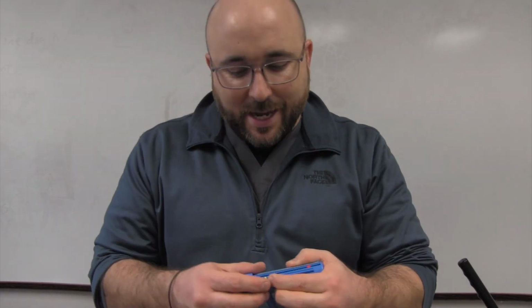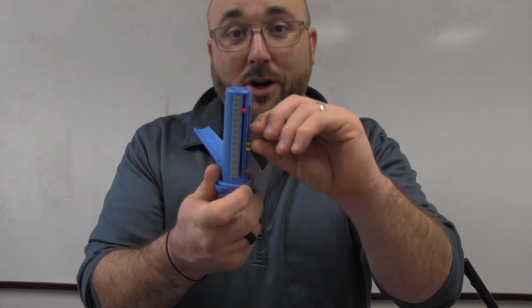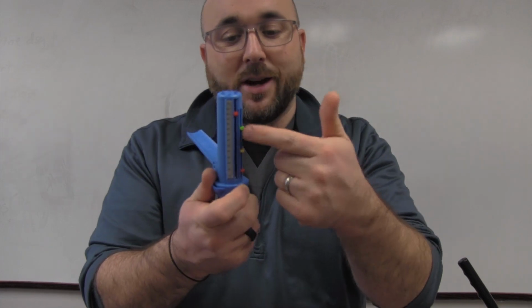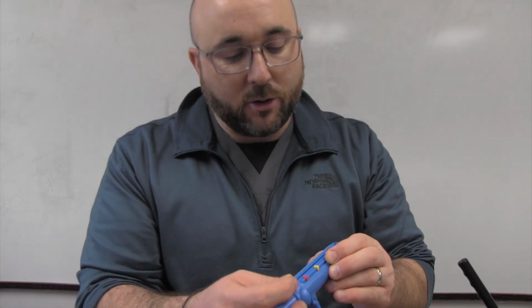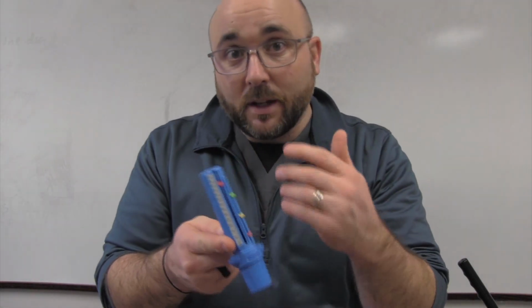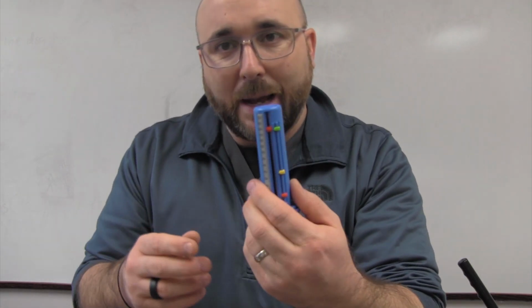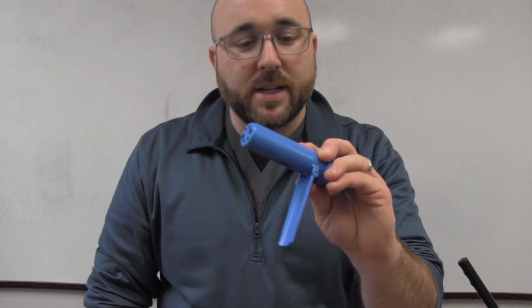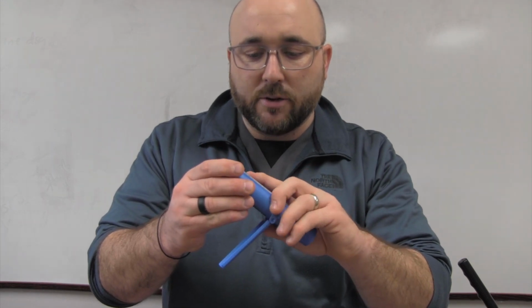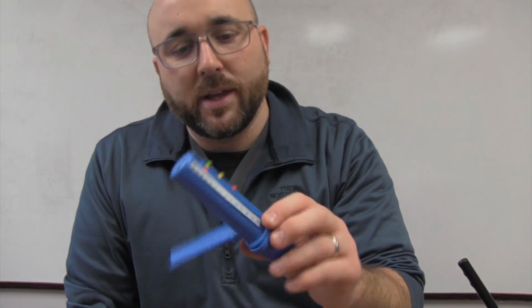After you figure this out over a week and you get your normal values, then we set these different pieces, and you can see these little colors here, by what your zones are. Green, yellow, and red. Obviously, green's go, yellow's yield, and red is the bad news zone. So we would put the green at 80% of their total, or we could actually put it at the top. This is the way I would usually do it. I'd put their top as green, 75% of that I would put yellow, and 50% of that, which in my case would be 300, would be a bad day. There's a specific formula for this in the asthma education program.